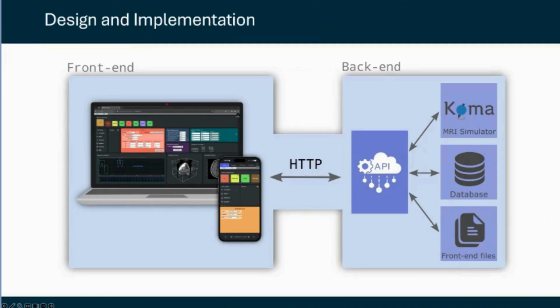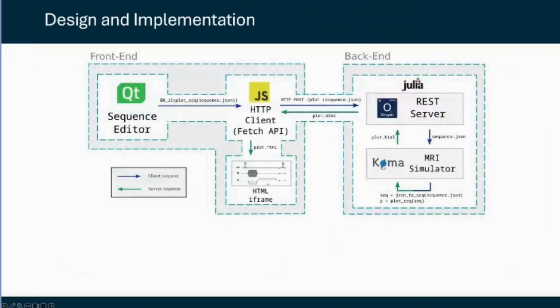So going one step deeper, a big portion of the front end is written in Qt, which is a C++ framework for user interface development. And thanks to WebAssembly, you can compile that C++ code so it can be run efficiently in the browser.